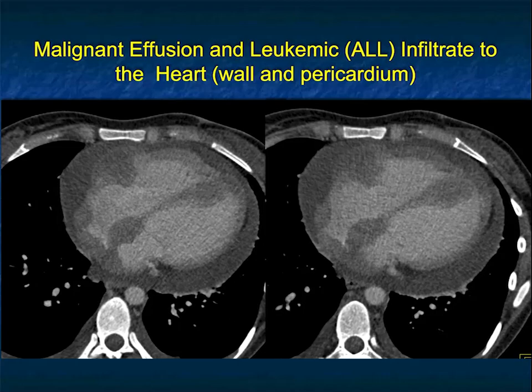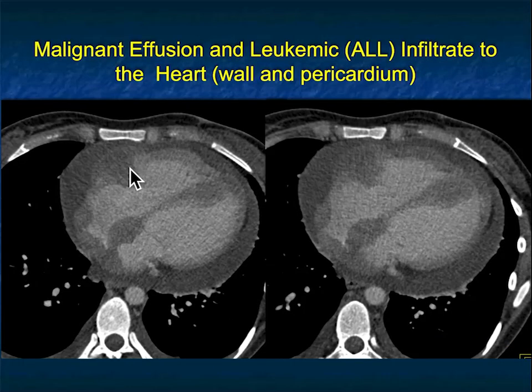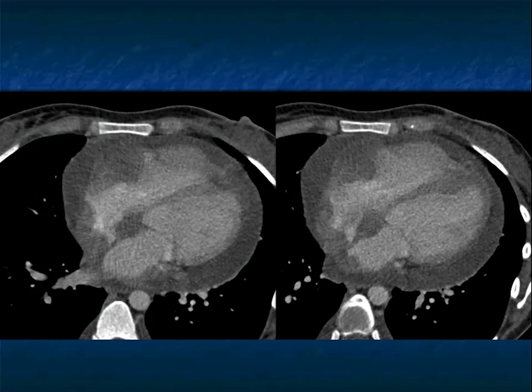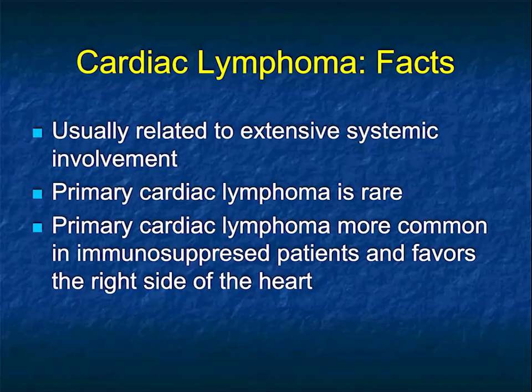Here's another patient with a pericardial effusion, but you also see masses on the patient's right atrium. You can see the lobulation of those masses, also in the interventricular septum. So now we're talking about multiple masses. We're also talking about pericardial effusion. And that's a good diagnosis. Leukemia is one of those things, as is lymphoma, as is metastasis. They can give you multiple lesions that are spread apart, involving multiple different areas. Just a really nice example, including involvement in this case of the patient's left ventricle.